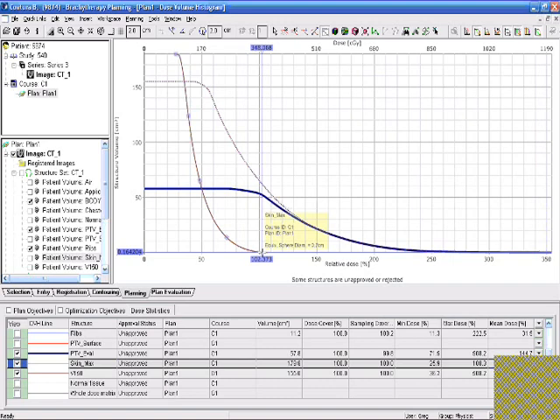Well, it's in there somewhere. Okay, at about 0.1 cc, this is the maximum skin dose. It's about 103%. For a challenging case like this, that's really a good result.